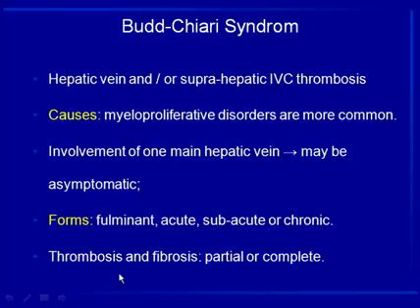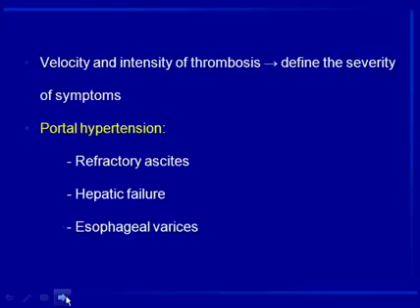Thrombosis and fibrosis of the hepatic veins can be partial or complete in one or in all the main hepatic veins.